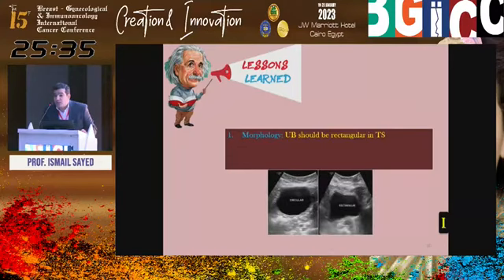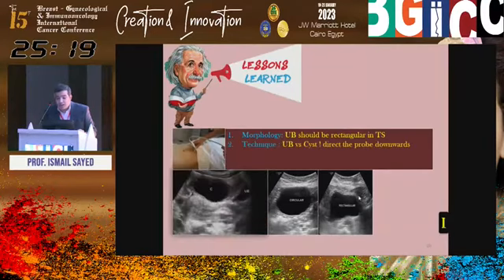So lessons from this case: you have to revise the basic morphology about urinary bladder and cyst. Ovarian cyst in TS should be circular, not rectangular, okay? And urinary bladder should overlie the vagina, should be seen starting inferior and behind symphysis pubis, not above.